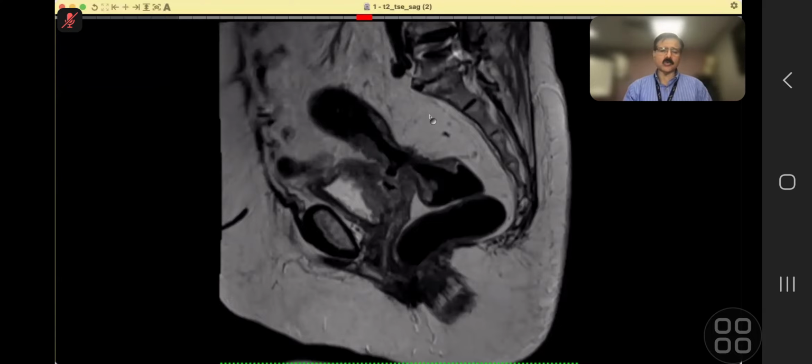That is why I showed you that sigmoid, exophytic type of mucinous tumor. So many of these were, and you remember that diverticulum case where the tumor was sitting in the bladder diverticulum, such a huge tumor. So this was just a bit of fine touch, and develop your eyes on axial anatomy.